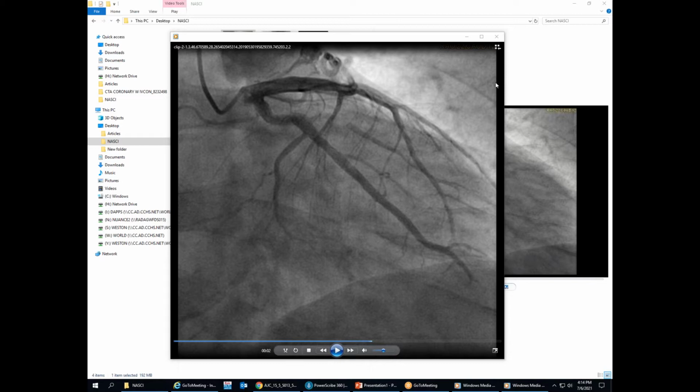That means that those are the septal perforators. They almost always point towards the patient's feet. "Always" is a horrible word in medicine, I guess. So that's how you can distinguish which vessel you're looking at. And the other thing here, you see there's very early opacification here.